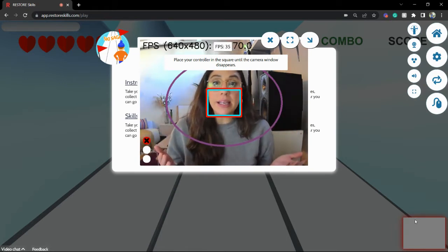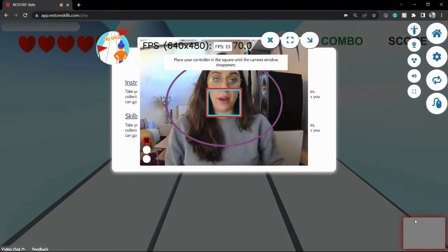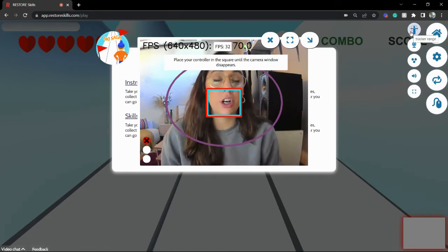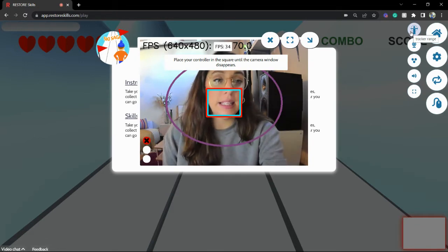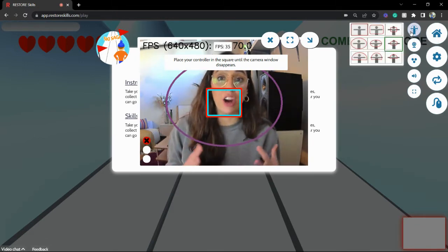And here you can see I have a purple oval that is kind of framing my upper body. It's stopping here at the center of my chest. And I did that in order to adjust how much movement is necessary on the screen. We have here an icon. It's our tracker range. On the right side of the screen, we have a person icon. Their arms are out with that circle around them. And that is how we're able to find these different frames or tracker ranges.